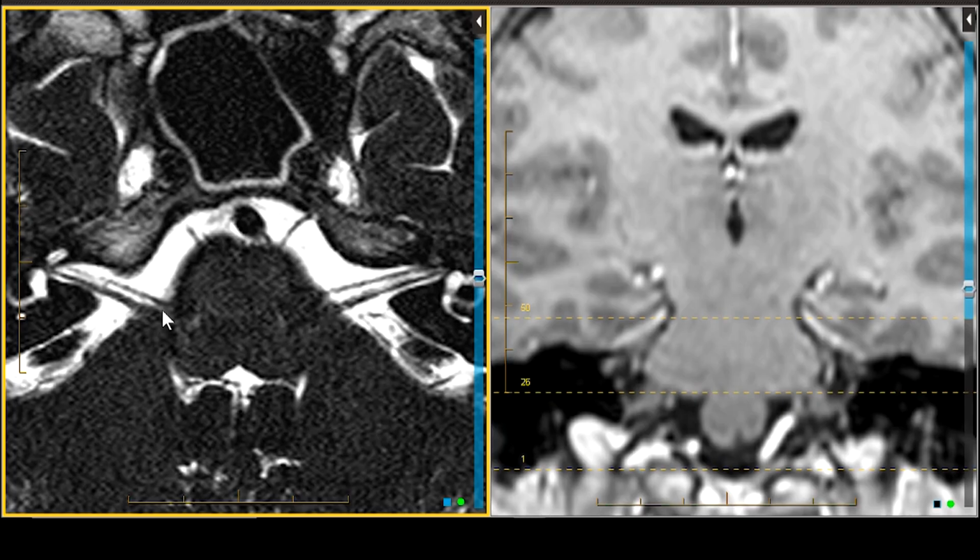The vestibulocochlear nerve is accompanied, by the way, by a very tortuous structure. You can see a little bit of it right there. This connecting antero-posterior oriented area of flow void is known as the labyrinthine artery, which arises from branches of the anterior inferior cerebellar artery, or AICA, at the cerebellopontine angle, and goes with the 8th nerve into the internal acoustic or auditory meatus.